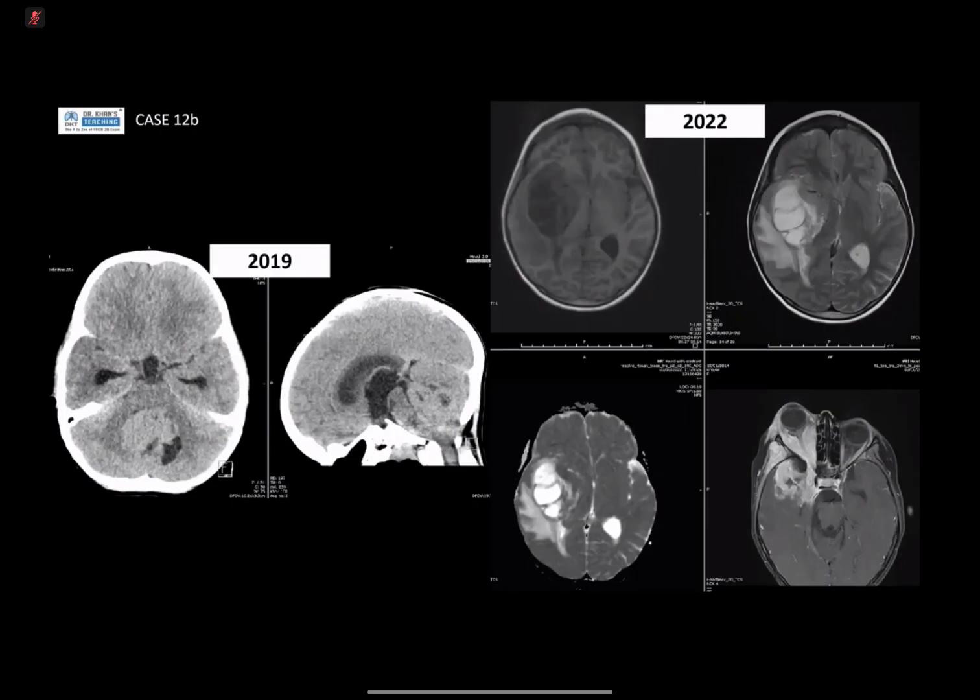The others do have metastases down the CSF, like neuromets, but it's just an interesting case because you should take note of the timeline. If you hadn't realized this was some sort of brain tumor, because I think it looks fairly aggressive, right? Because you've got hydrocephalus there as well. And again, with posterior fossa lesions, you would think brain tumors first. And then if you see 2022, why have things changed? Things do look fairly aggressive, with cystic components, although I didn't give you the full slices. Then when you look at the post-contrast one, in the bottom right-hand corner, there's a lot of enhancement. It involves the bone, it involves the brain, there's proptosis. It just all looks very aggressive.